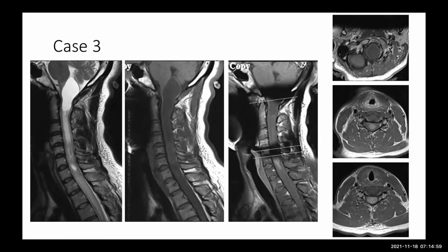And what's going on at the foramen magnum? At the foramen magnum, there's an excessive amount of fluid. Is that a cyst? Is that a syrinx?